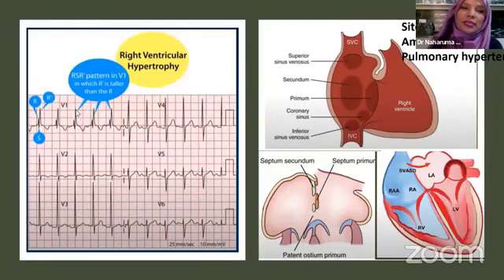And if we see the terminal portion of the R prime, this is due to RVOT dilatation. So the more RVOT volume overload, the more will be the magnitude, the taller the R with terminal portion. And this tells us the magnitude of the shunt. We know that ASD secundum usually has normal axis or right axis, but what about ASD primum? There is an endocardial cushion defect.